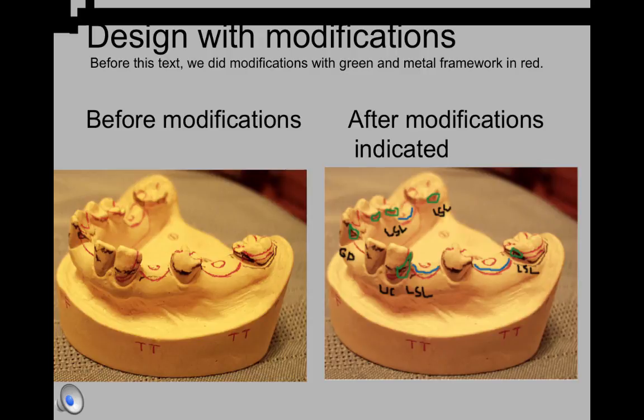I included this picture because, again, it's a different option that you can use where you clasp the canines and the posterior molars. But also, it's a very neat design, well defined, and there's no question about whether or not you understand, say, interferences in this particular design, or that you understand the placement of clasps, how clasps are supposed to be drawn.